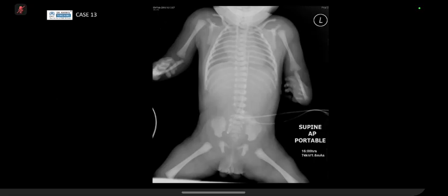I would check for vertebral anomaly. Okay. So do you see a vertebral anomaly? I search for it here. Okay. I see vertebral, limb. I see some could be some abnormal upper limb. Mm-hmm. The E for esophageal. C for cardiac anomaly. I see could be cardiac enlargement. T for tracheoesophageal fistula. Mm-hmm. I don't remember the rest actually.